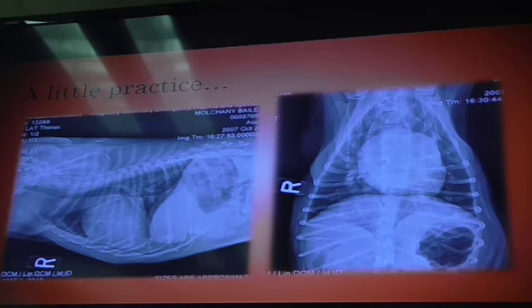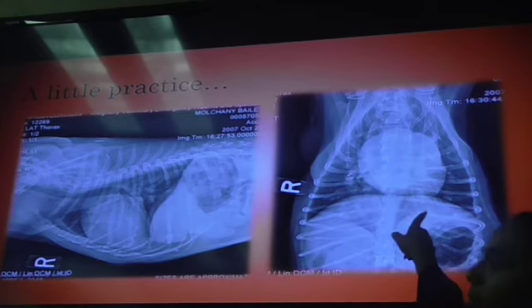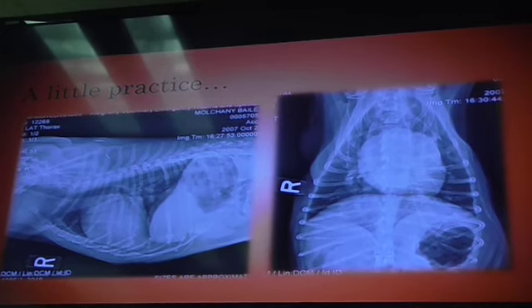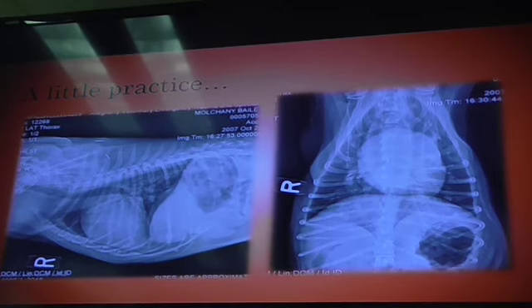Yes, ma'am. Could you point to where it bifurcates one more time? Right in here. And then it comes down around. Yes, ma'am. Okay, so that's the trachea. What's the other tubular opacity? Oh, so that gets a little funkier, right? So you gotta put on, remember this is a bunch of shades of gray? And it's a play on lights.